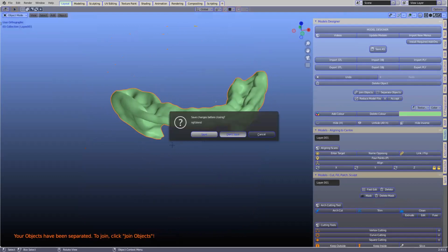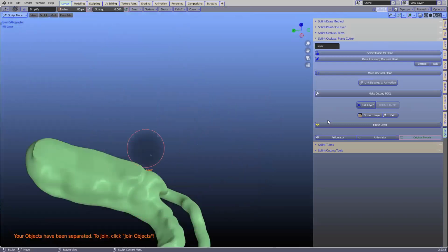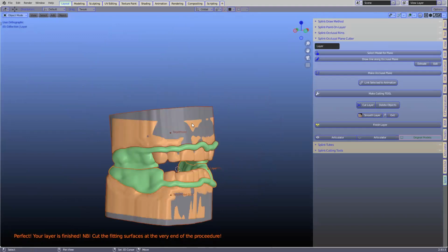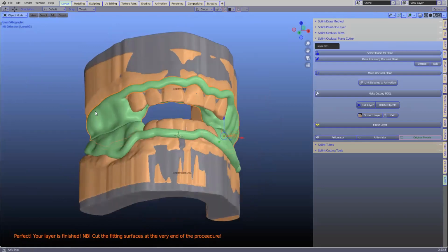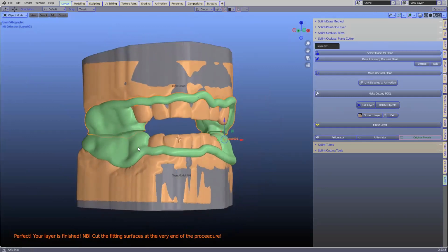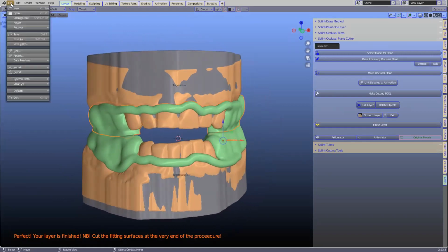Okay, so where were we now? Okay, so there's a question brought in, attachment. Ivan, if we can make a button like that for the flat cut. In the splint module, yeah, maybe. No, but maybe all three, flat cut and a Monson cut. Yeah, maybe. I think it could be a good idea. Okay, I'm not going to go through the smoothing again, because I don't know how many more of these attachments you're going to have whack in. I'll stop asking you questions.